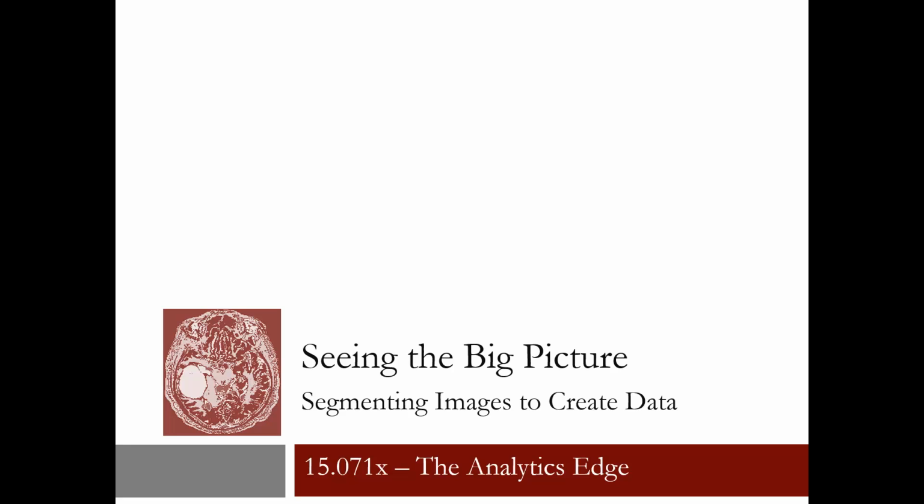In this recitation, we will see how to apply clustering techniques to segment images, with the main application being geared towards medical image segmentation. At the end of this recitation, you will get a head start on how to cluster an MRI brain image by tissue substances and locate pathological anatomies.